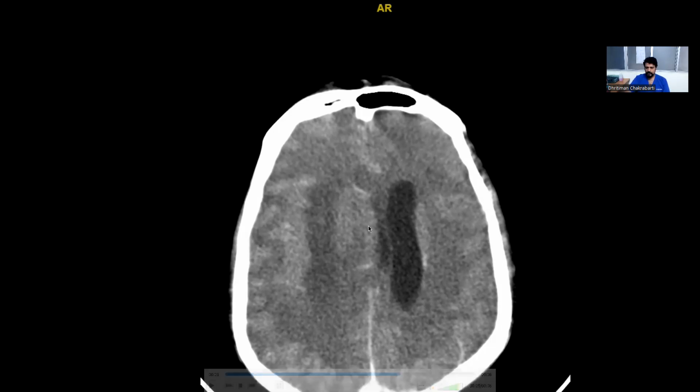Okay. So I guess this covers whatever I wanted to teach in this video. You learned a little bit about the anatomy of the posterior fossa, a little bit about anatomy of the ventricles, a little bit about transtentorial herniation, and a little bit about subfalcine herniation.